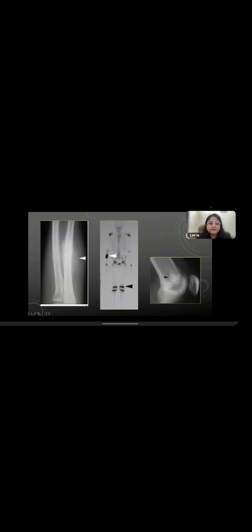And here in the distal part of the bone, you can also see Codman type of periosteal reaction. Large soft tissue component and new bone formation: osteosarcoma. And CT chest of the patient showed large cannonball metastases, multiple nodules of random size, randomly distributed, pulmonary metastasis.